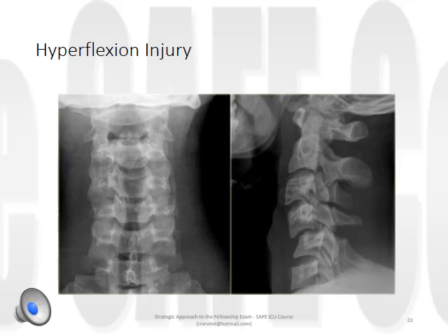The hyperflexion injury has occurred at C4, C5 here, with widening of the interspinous space at this point as well. There's subluxation of about 25% anteroposition of the AP diameter of the vertebral body. If you look at the distance between the C4, C5 spinous processes, it's widened, and you can see also that the C4 and C5 spinous processes appear shorter in the lateral view than their mates. This is because of rotation at this point.